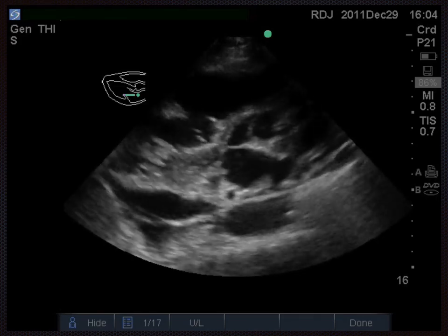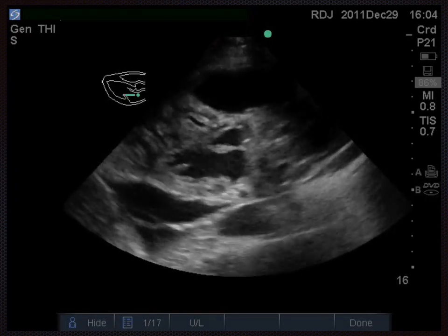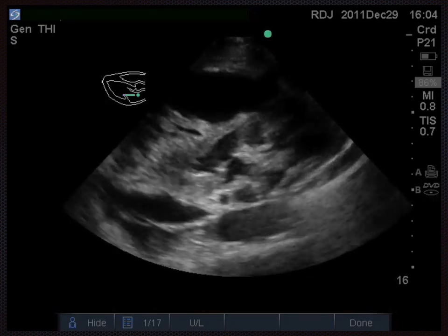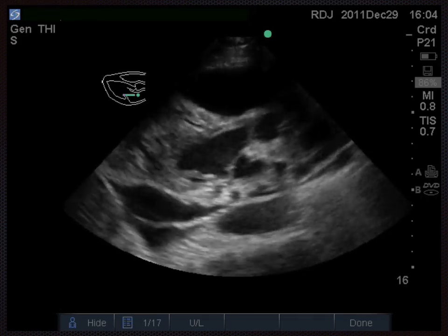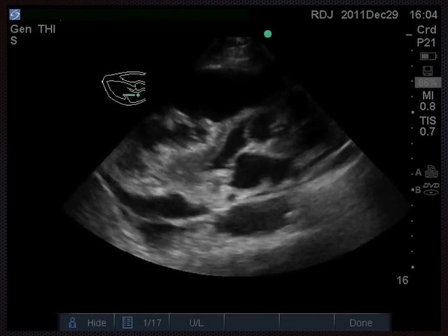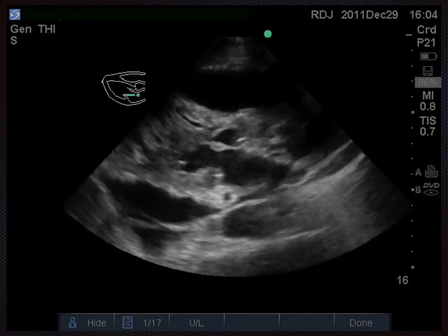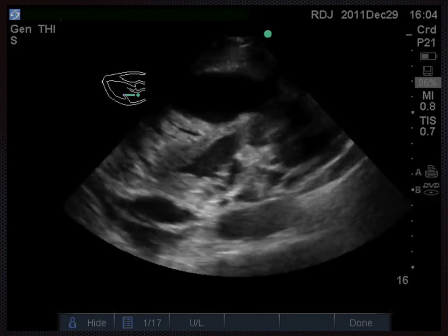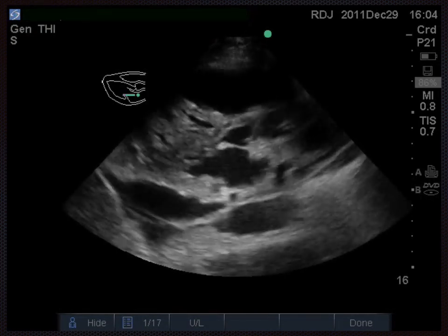So there's also a suspicion below and to the left of the descending thoracic aorta that there's possibly some pleural fluid also. So there's fluid above and below the pericardial line. So from a fluid evaluation point of view, I would say that there is probably a pericardial and a left pleural effusion. And if we were to look at the maximum diameter we can see of the pericardial fluid, certainly goes up to about 2 centimetres in thickness. Although arbitrary, it certainly gives you an idea that this is not a tiny pericardial effusion.